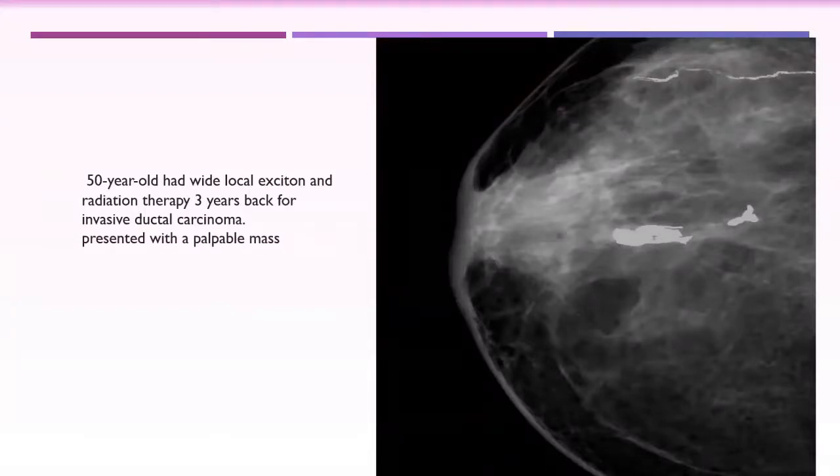Previous mammography is not available. Everything is normal except for these branching high-density opacities.